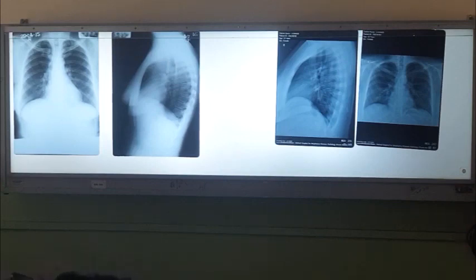So identification is important. Even if the name and everything is there, just look at the patient and look at the X-ray and see whether this particular X-ray belongs to that particular patient. You have to think of that. Sometimes a lot of mistakes can happen in the chest X-ray department if there are same names and all, right? So you have to look for that also. And there is no excuse if you put an ICD to some other patient by looking at some other X-ray, doing various invasive procedures, right? So you have to be clear, and so the identification is very important there.